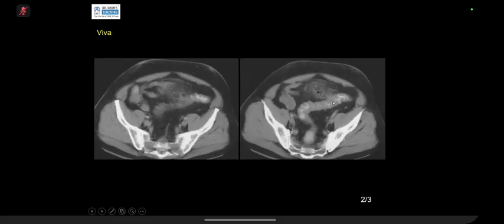First of all, look at the colon. You remember I showed you pseudomembranous colitis? Now you see how mucosal thickening looks like. This is mucosal thickening. Is there a difference? No, there is no difference, except that that was too much, and that was pancolitis. So take-home point is that all kinds of colitis will appear similar, right? The pattern and the magnitude is something else. But here, there will be a pathology sitting next to it.